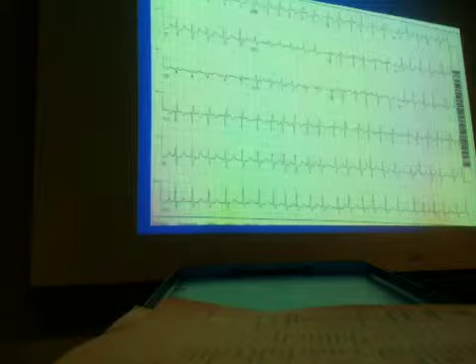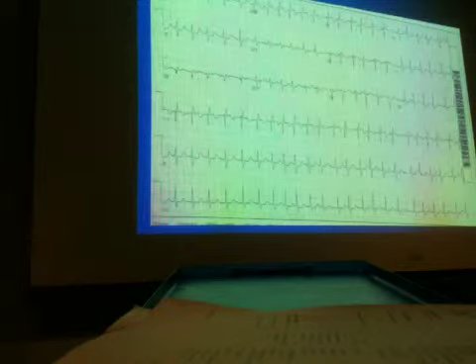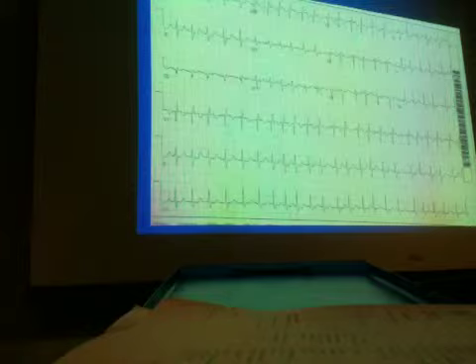Do we have P waves? I see a lot of head shaking. So what do you think this is? I'm sorry? Exactly.